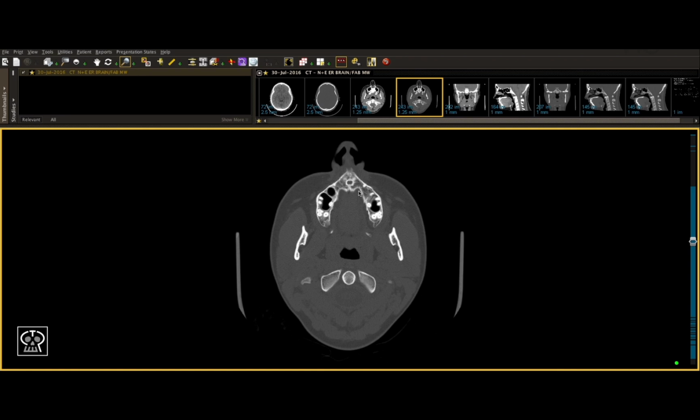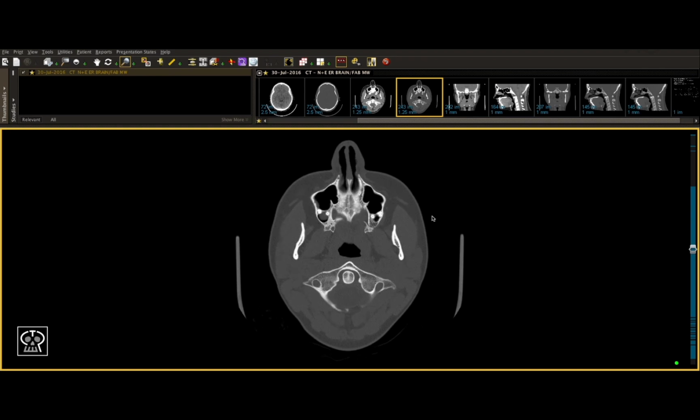As we continue to scroll through the maxilla, we'll get to the bony flat plate as you see here, as well as this line right through the middle. This is an example of normal anatomy and represents a suture line, as the right and left processes of the maxilla fuse during its formation and form the suture line along the middle. Although this may look like a fracture, once again, this is normal anatomy and can be expected to be seen, especially in younger patients.